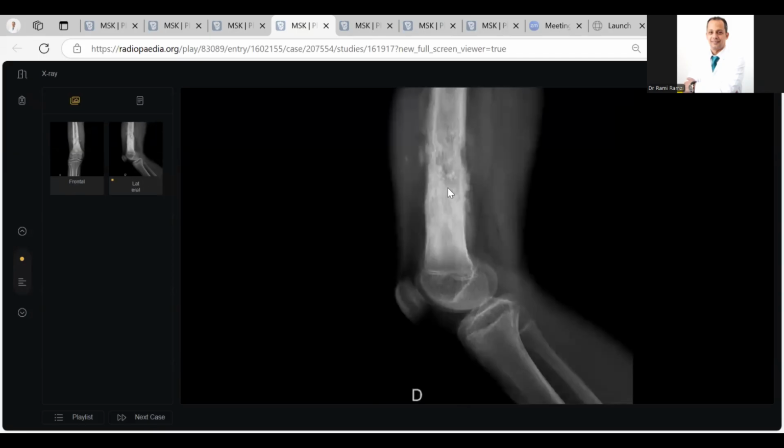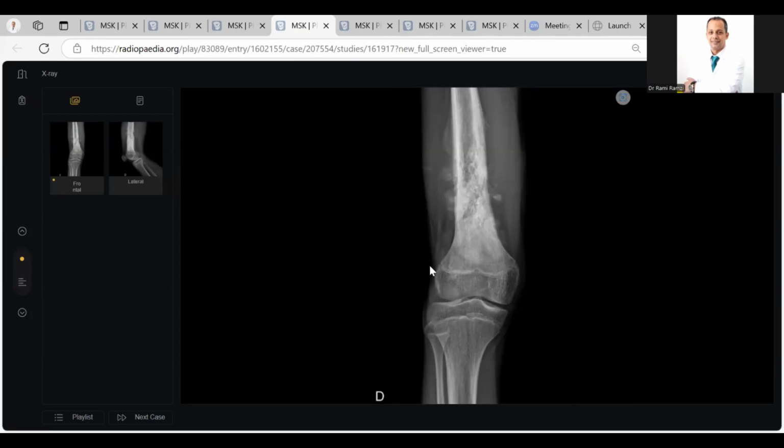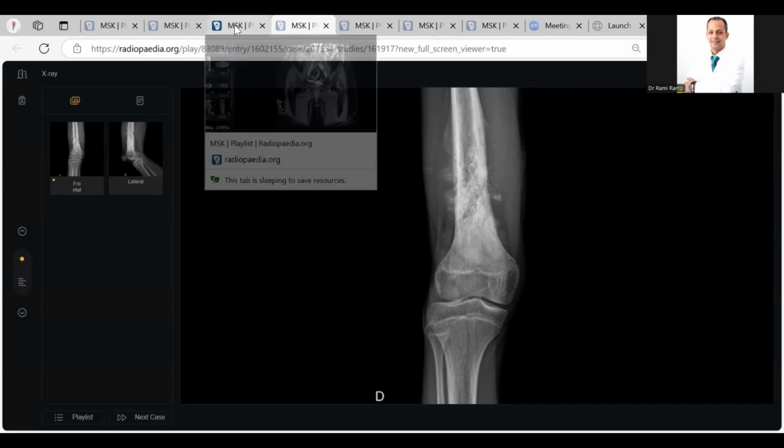Second point, it is too difficult to make the diagnosis of osteomyelitis just after osteosarcoma. Make it at the end because it looks like tumoral. So I must say osteosarcoma, then Ewing sarcoma, because I think this patient is around to close the epiphyseal plate, around puberty. By the way, take care of other types of osteosarcoma: telangiectatic, parosteal, and periosteal. Take care especially of telangiectatic. It is very tricky. Okay?